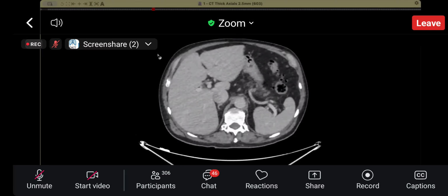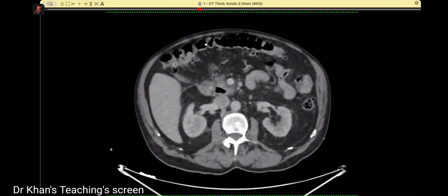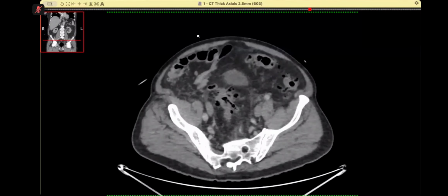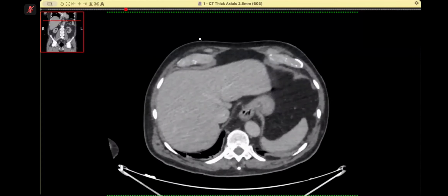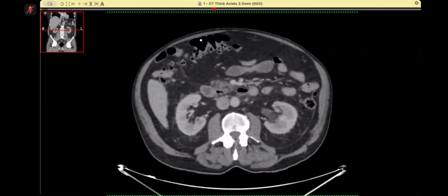Now, I'm sure it was too busy a scan to pick that up quickly, but the eye sees what the mind knows. So candidate 3, when you said I'm looking at the vessels, I said, wow, he is going to get it, but you just concentrated on arterial vessels.